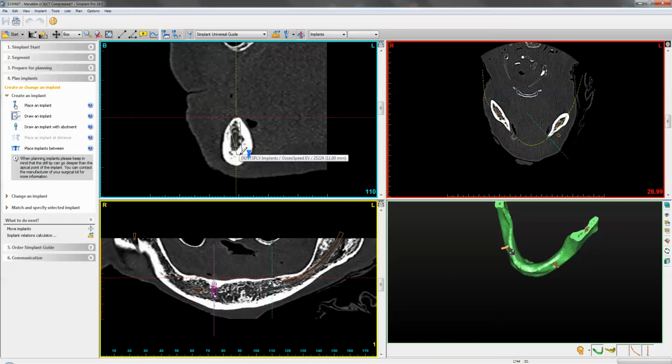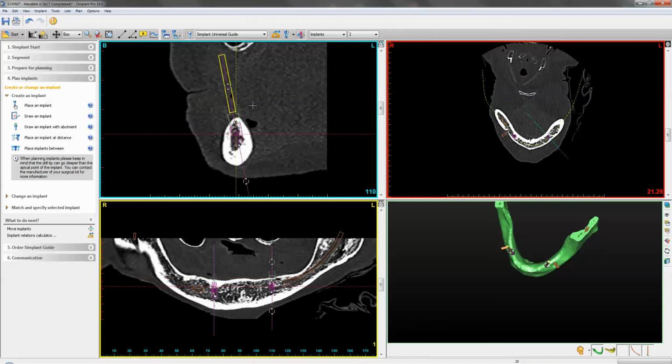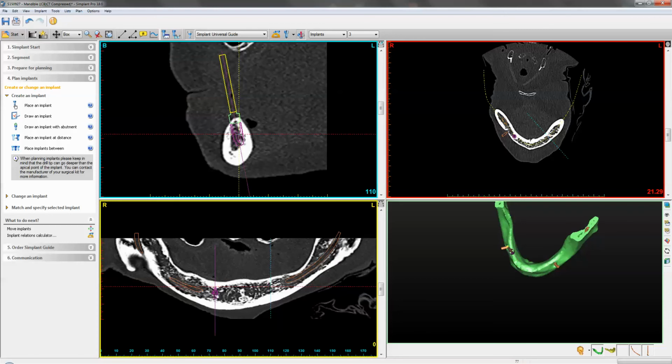And then I can stretch and angulate at the same time. So I'm doing both in one go, killing two birds with one stone. I'm pretty confident on this one being a more effective tool for better planning in terms of speed. So in this particular case, I would say an 8mm should be fine in this particular angle. Again, you've got the same sort of tools available for fine movement tweaking, but generally with this tool, you don't really need to do that much of an adjustment.